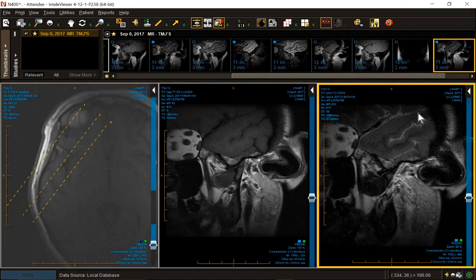Are they able to open on the right? Yeah, they are. So open lock with modest condylar translation. So there is the ability of the patient to go from this position to this position. So it's not a closed lock.